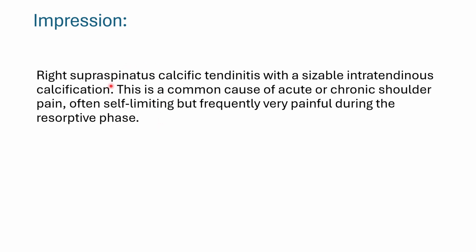Basically, you don't really have to put all of this in your report. You can actually put the impression as insertional supraspinatus calcific tendinitis. That's your impression or the comment that you can give. But this is just good jargon to correlate with the cause of pain to a referring clinician whom you are used to. So don't really do this when you're doing your reporting.